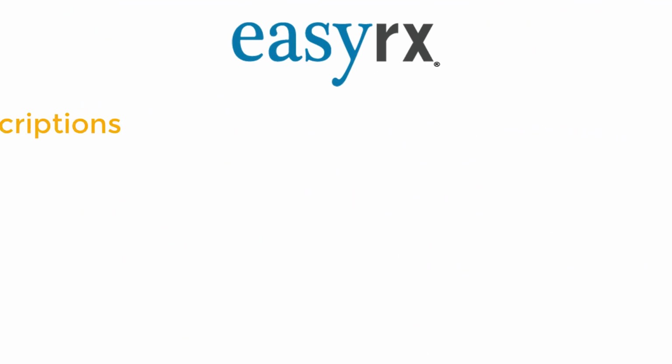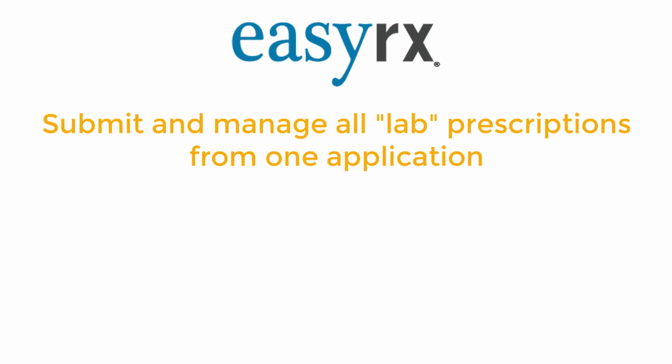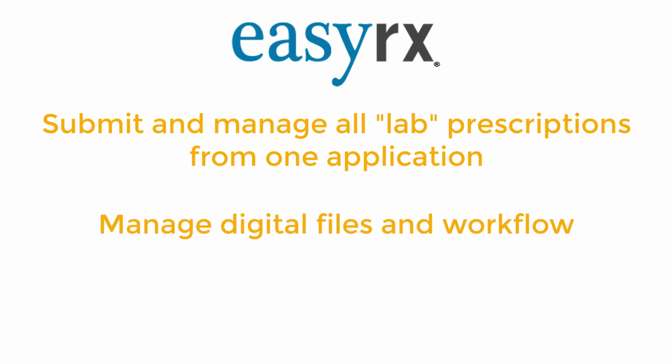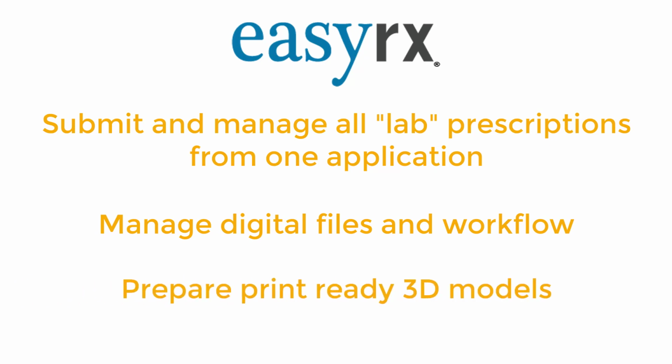To recap, EasyRx helps you submit and manage all of your lab prescriptions securely from one application. Now, lab prescriptions can mean a variety of different things. Traditional prescriptions like Essex or Hawley's, in-house clear aligners, or digital treatments like a customized bracket system. All of those different prescription types can be tracked and managed in EasyRx. EasyRx is a secure location to manage all of your digital files, and a powerful software to help prepare print-ready 3D models.